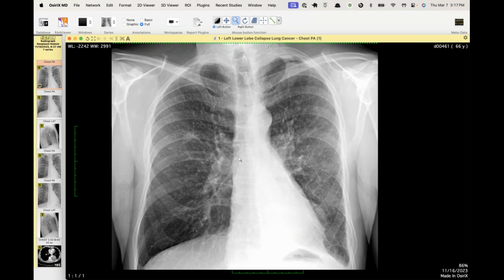The interesting thing is that the worse the lower lobe collapse is, the lower the volume, the harder it is to see. It gets tucked right against the mediastinum. So, you might not see very much here, maybe a little paraspinal stripe on the frontal view. There's a little bit of mediastinal rotation here. And on the lateral view, the spine sign may be the only hint of it, because you don't actually see an edge very well. So the worse it is, the harder it is to see, which is ironic.